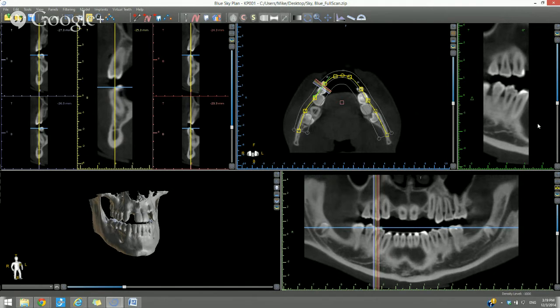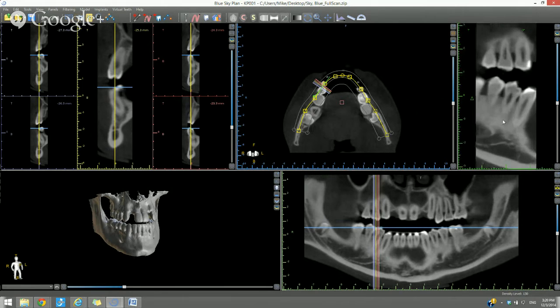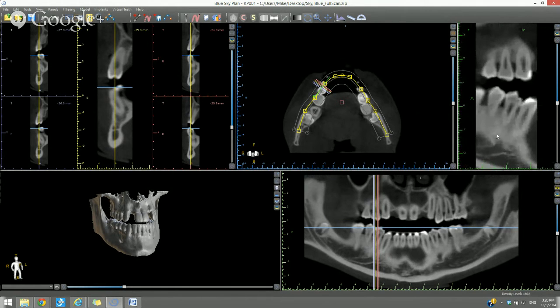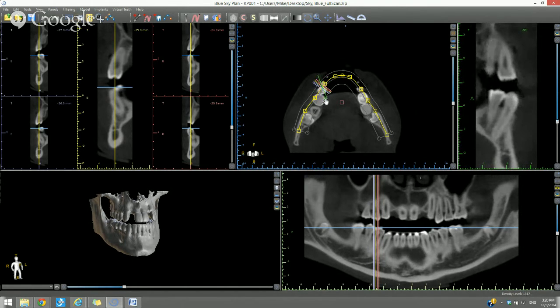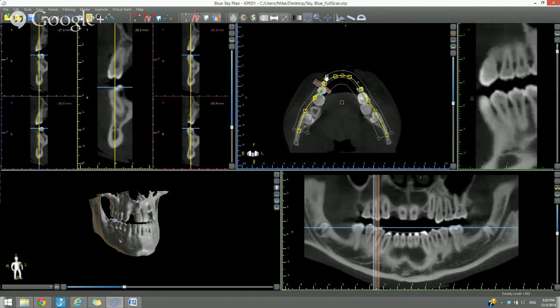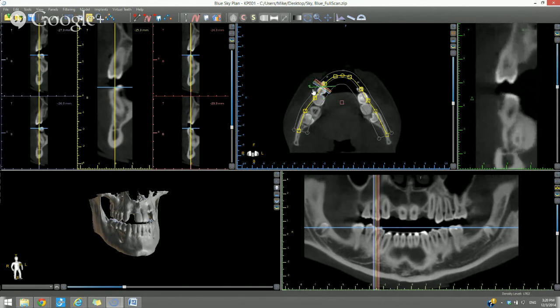Let's move on to our tangential view, which is our top right view. The mouse functionality is the same: the zoom in and zoom out with the right button, you're grabbing the image with the wheel of the mouse. The left mouse button here doesn't update the view. The way to update the view is to scroll using the slider. Another way to do it is you could see in the axial view, you have a green line. You're able to grab the green line and rotate it. What the green line is doing is demonstrating the angle at which we're viewing the tangential view. Again, the tangential view shows us 360 degrees around an implant or around the patient's anatomy, and we could rotate all the way around. It's especially helpful, for example, if you place the implant into a bone and you want to make sure that it's placed properly. So that is our tangential view.